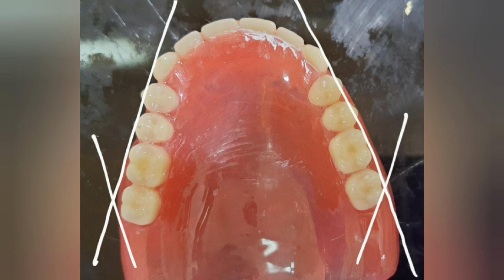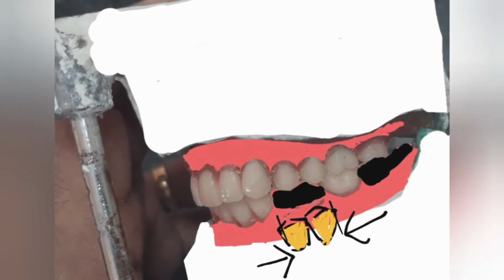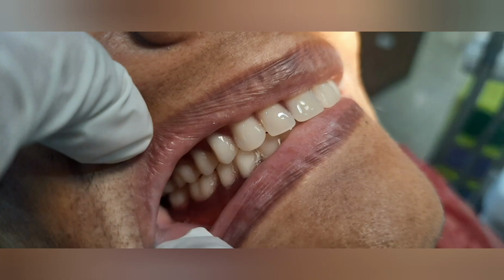This will prevent the dislodgement of the distal extension of the denture and helps the denture to follow the ridge configuration. Once the lower anterior teeth are placed, remove the wax from the first molar area and place the lower first molar in proper class 1 relation. Next, you can remove the wax in between the first premolar and second premolar area and place the first premolar and the second premolar in proper intercuspation. Most often, you may have to trim the premolars to accommodate the teeth. After that, you can place the second molar in proper intercuspation and finish the process.